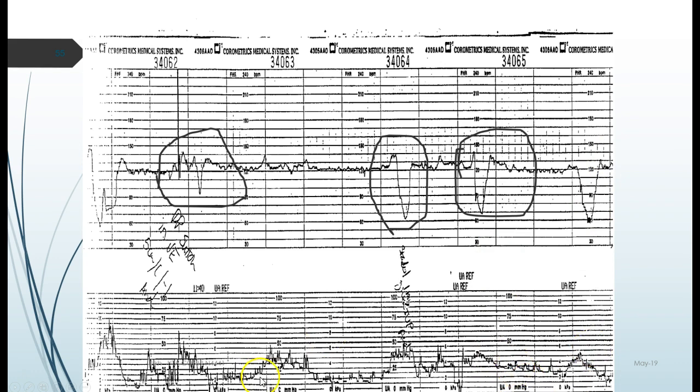I would clean this contraction pattern up a little bit, see if I could get a better looking strip on there so that I could tell exactly when those contractions start and stopped. We know that the doc came in the room. He did a vaginal exam just to make sure we don't have a prolapse, because I'm sure we were probably seeing this before. And so we're going to watch this one.